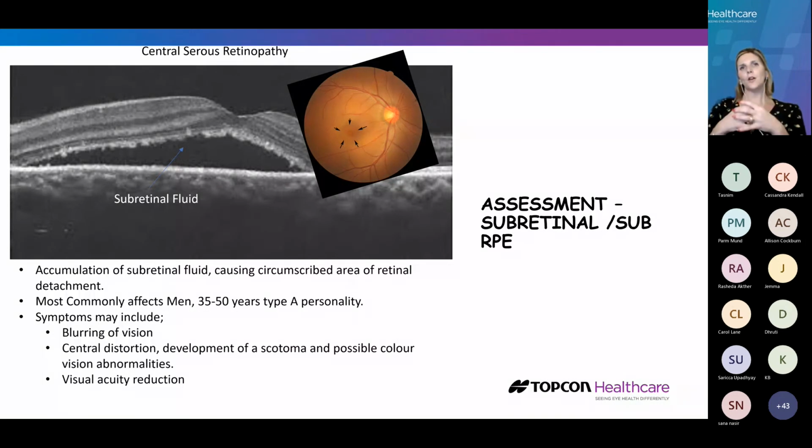If you're interpreting an OCT scan and you've not captured it, it's really important to do quality control checks yourself to make sure that you're looking out for those artifacts and changes with those patients.